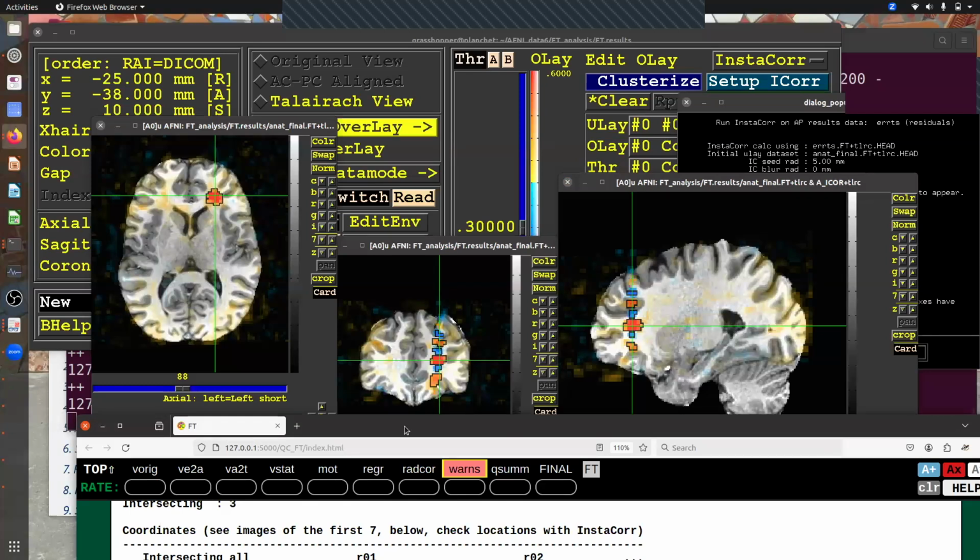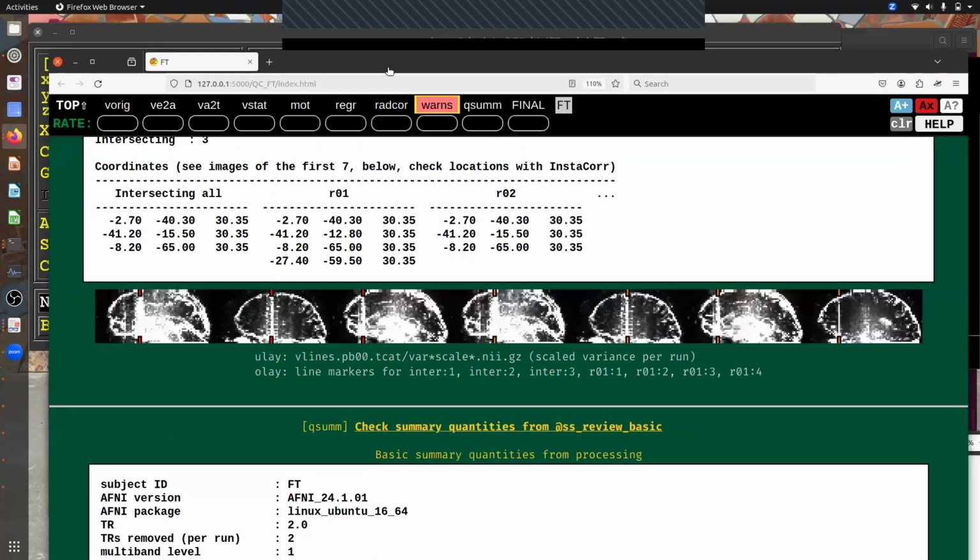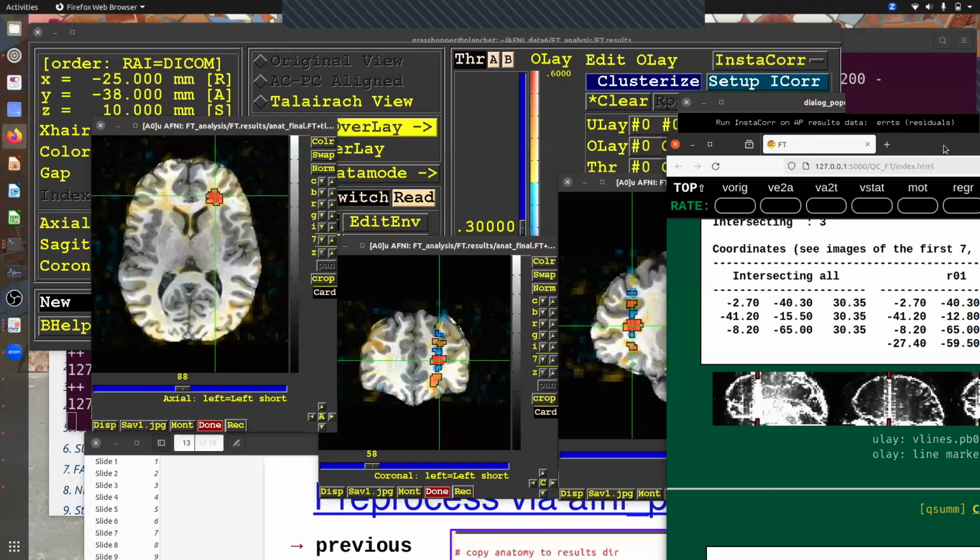We don't actually know why, but it's something related to a frequency in the room or a radio signal or something that's doing bad things to our data. For a task-based data set like this it might not be a problem. It fortunately occurs in parts of the brain we're probably not studying, but for a resting state data set, this would probably torpedo it because it injects this very strong correlation, anti-correlation pattern.